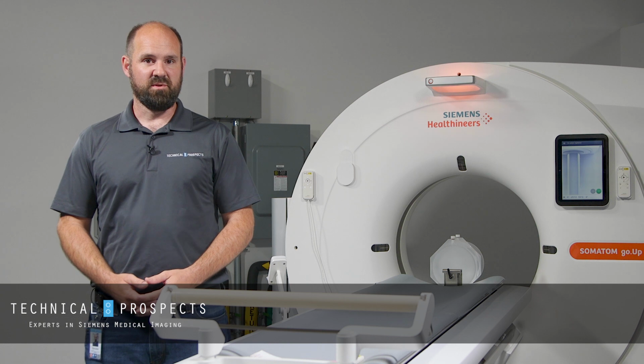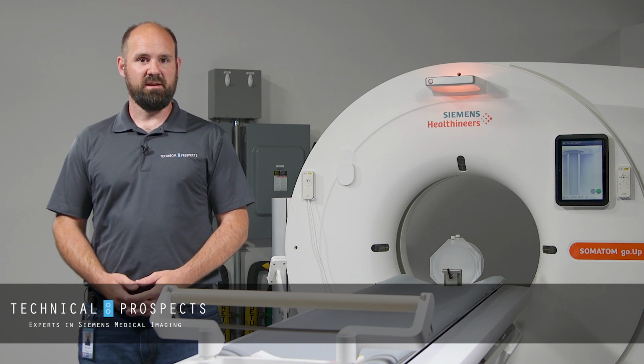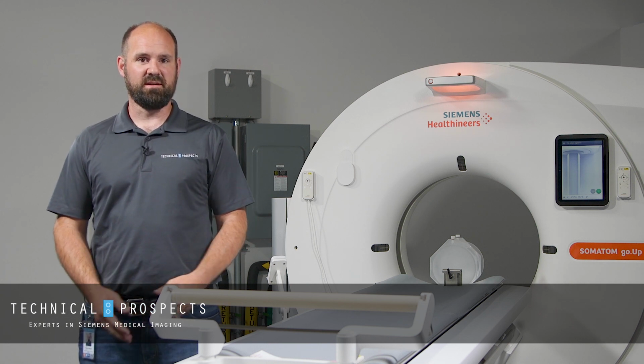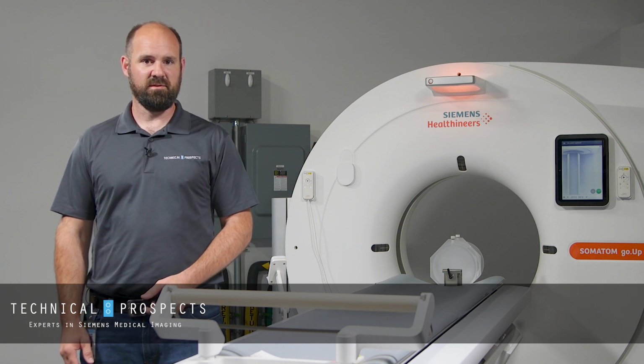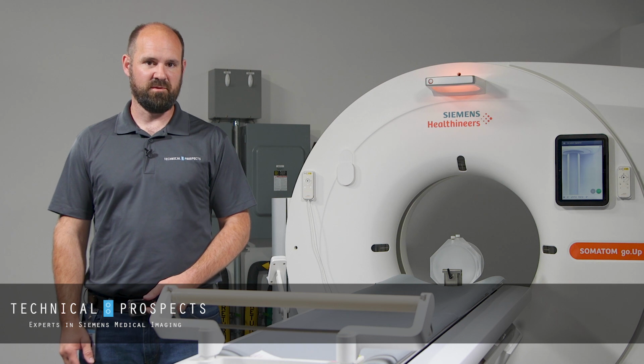Whether you're a seasoned expert or just getting started in medical imaging service, this series on the Syngo Go and Syngo Native is designed to elevate your comfort and knowledge of the platform.